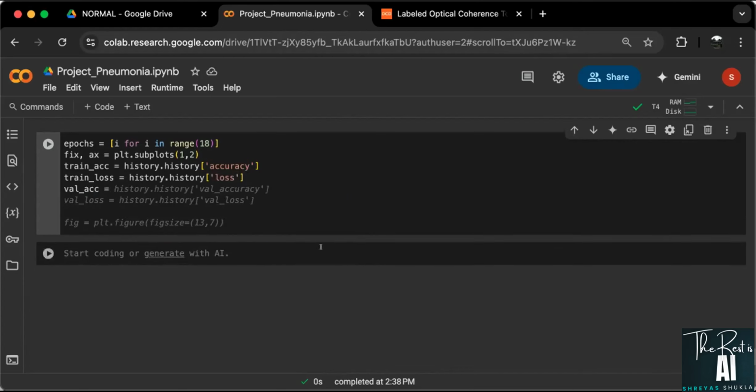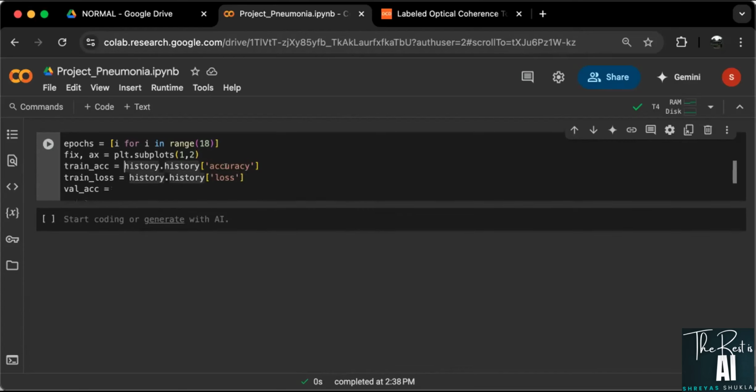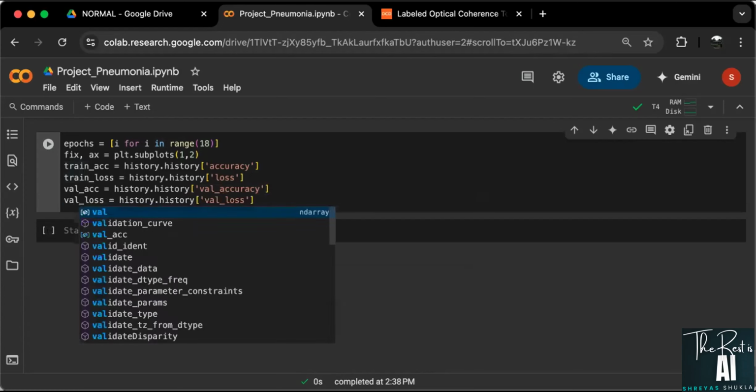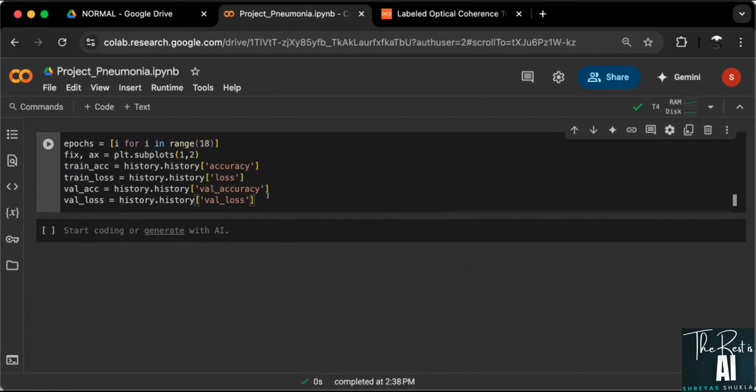I'll just copy some of the things here, it's not actually required to write it. So this is validation accuracy, this is validation loss, and this is validation loss as well. Okay, so we have got this.